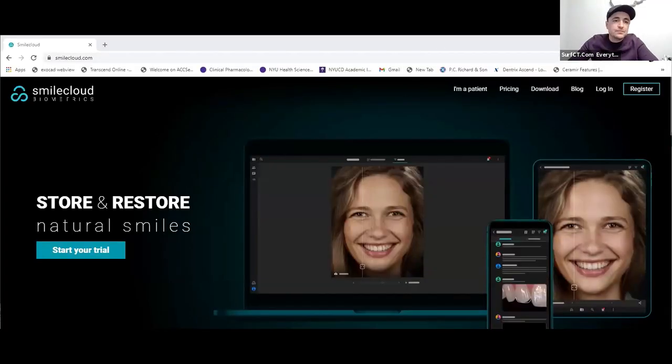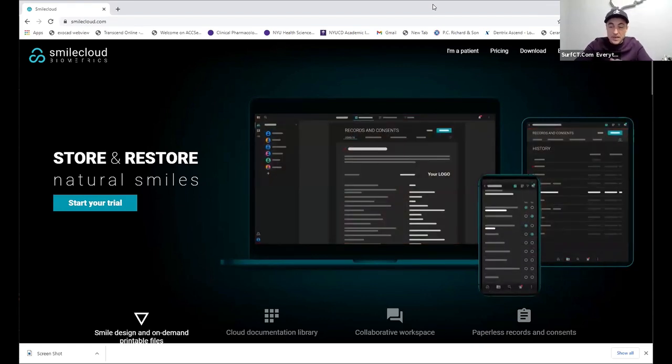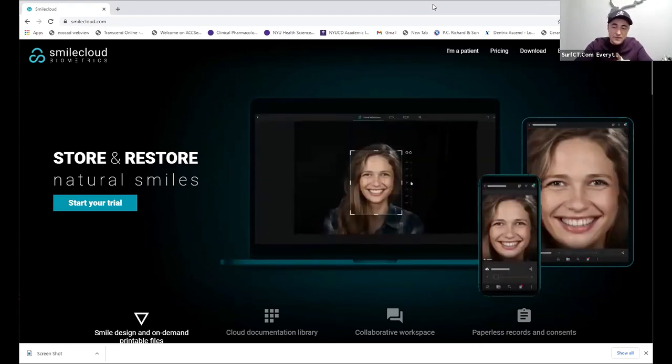So this is a website, SmileCloud.com. It's basically done by Florin Kofar.